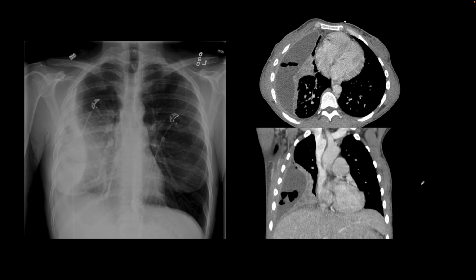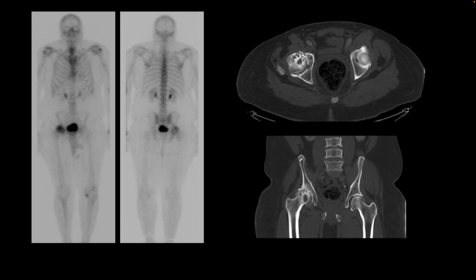This is our next patient, and here there is a good correlation between the CT and plain film finding. Let's start with the plain film on the left first. There is an opacity involving the peripheral aspect of the right lung field, and this opacity corresponds to this large collection associated with pleural thickening and enhancement, and also internal air or gas also seen here. And so it's like a loculated effusion with signs of superimposed infection. So now it is called an empyema or an infected pleural effusion.